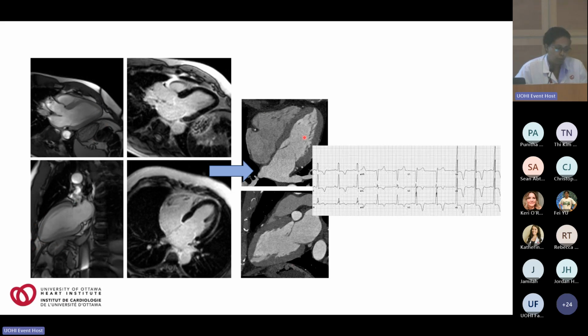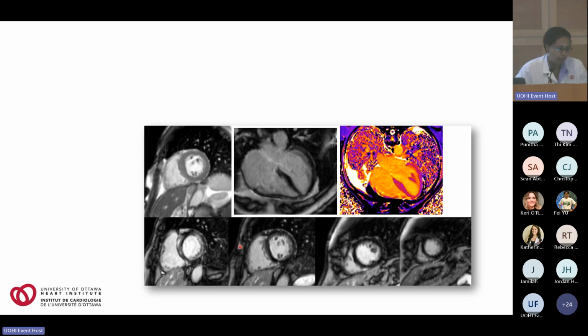That's true, but the patient later on had a CT a few years later, and we can better appreciate now that the apex starts to be more hypertrophied than the rest. So this is to point out in early recognition, we may not be as robust.